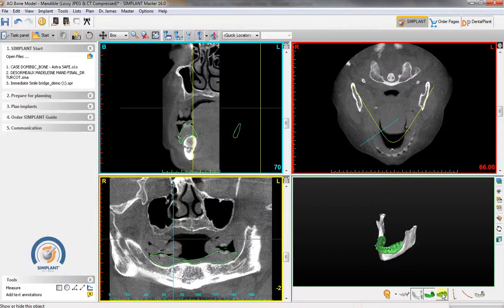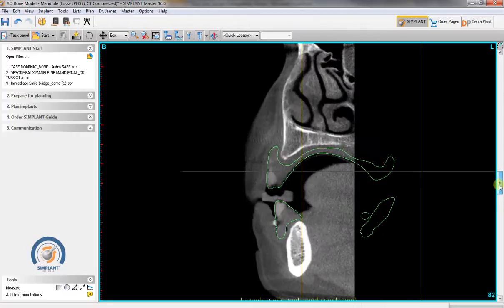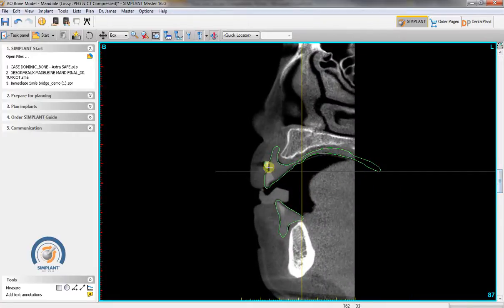So we can also, just to give you an example, we've done here a dual scan with both prostheses together. So now let's take a look at the maxilla. This is what it looks like when we activate the denture for the maxilla. And again, it's a very nice, well-fitted denture. We can see here just a tiny bit of air gap, which is not an issue. And what's most important here for the maxilla is that the palate fits very well, which is what we see.